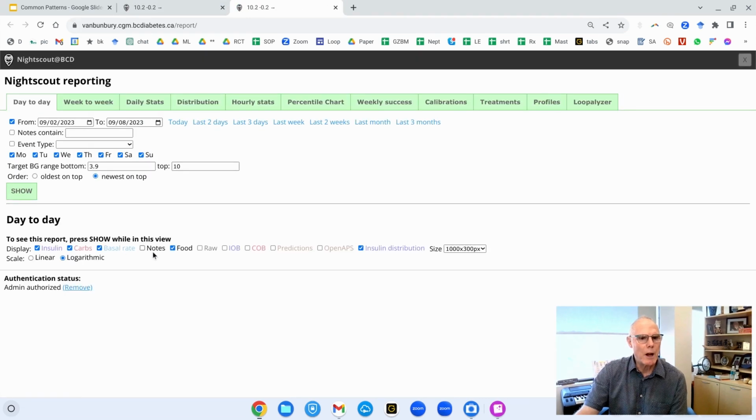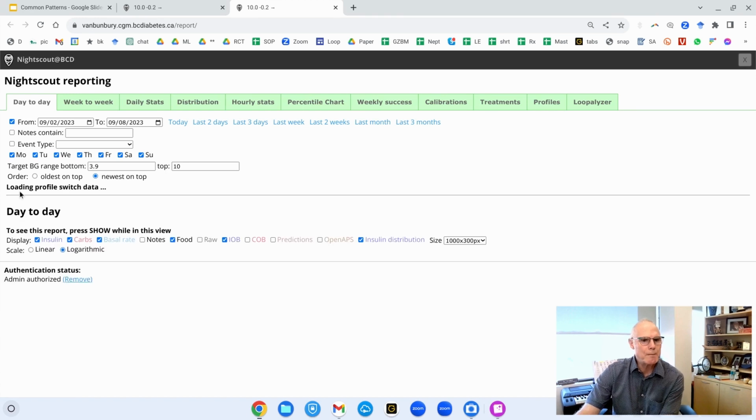And I'm going to show you 4 of the views. Our favorite is day to day. I'm going to click, I want to show you insulin on board. So that's not, you've got to click that yourself. You can see we're defaulting to 7 days.